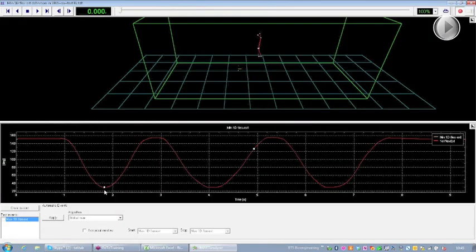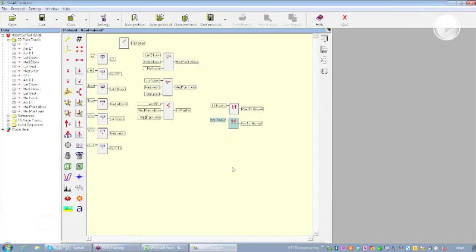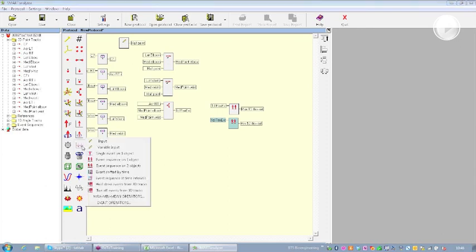So in this case they are going to be this, this, and this. Once I have the maximum point and the minimum one, I can define the range of motion. So I just need to select maximum less minimum, so I will have the difference between two objects always in the events.